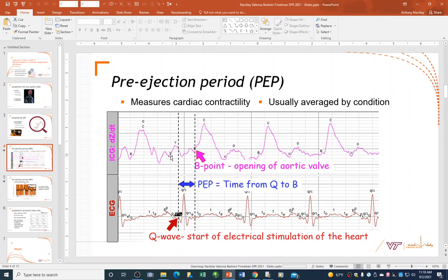Sometimes you'll see a Y in there. Here's a perfect example. Y is the next peak after the X. And then if there's room for another peak, that'll be your O. So sometimes you have B, C, X, O, and then sometimes you have B, C, X, Y, O. That may be less relevant. What you really need to do is make sure you see some cycles that look something like this: a little blip before, a tall peak, and then kind of a small hill afterwards, and then a new peak. So that's what we're looking for.